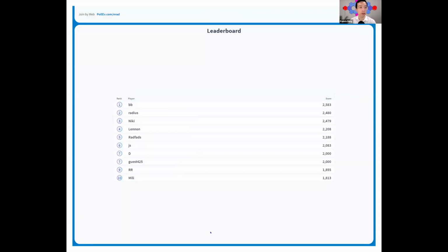There's a separation between this lesion, which is in the suprasellar cistern, and the dorsum sellae. So we have some separation on the leaderboard now. And if you just joined us, you can go to pollev.com/nrad for participating in the competition.